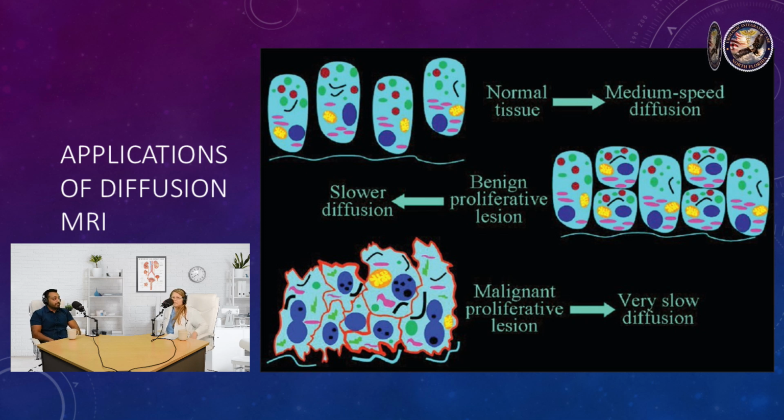Absolutely. And so for urologists, for clinicians, I think for me, the diffusion weighted image is the best thing. I just go and see what lights up, what exactly I need to pay attention to, especially if I'm limited on time and I'm seeing many MRIs. I'm like, okay, where is it? And then I can sort out, okay, this is the T2 image, this is the ADC mapping, and this is the ADC number. Great. So, okay, what about ADC mapping then?